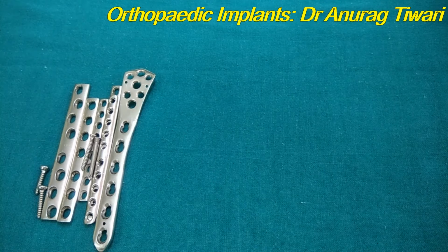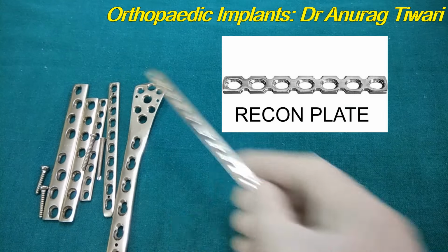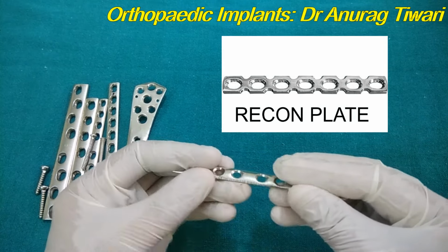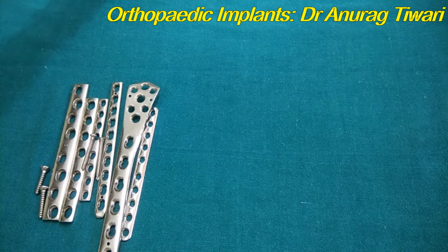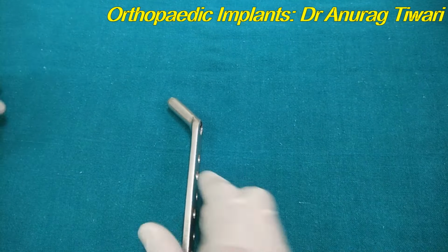Another plate which is not here is the recon plate. The recon plate is actually the same as these types of plates, whereas they have the mechanism that we can bend them in any direction, in any plane. So the recon plate is mainly used for particularly difficult anatomical regions where we want anatomical contouring of the plate, so we can use them. Now another set of plates.